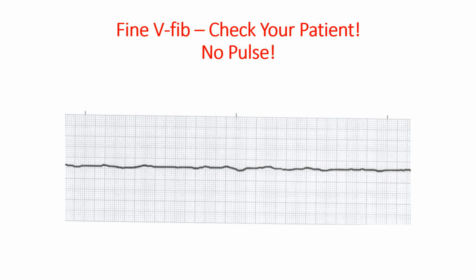V-fib may occur spontaneously or be preceded by V-tach. An artifact can mimic V-fib, so always check your patient and troubleshoot to correct artifact to make sure. So you treat your patients, not your monitors. So always check your patient, check a pulse.